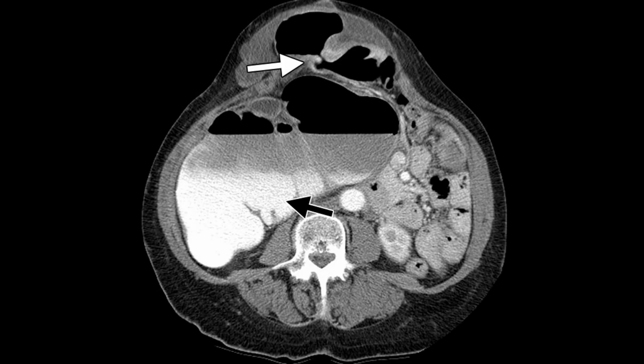Now this is one more case in which there is herniation through the anterior abdominal wall, which is causing obstruction and dilatation of the proximal bowel loop. So a hernia can also cause obstruction of the bowel loops; specifically, the large bowel loops can also be herniated.